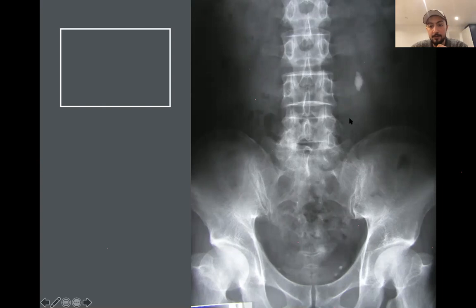If you look everywhere else, you can see the psoas muscle in here, some of the large intestine in here as well, and you can also see the inferior pole of the left kidney. Obviously need to pay close attention to that. The bones are clearly visible in here and normal. So this is a renal calculi or renal calculus because it's one.